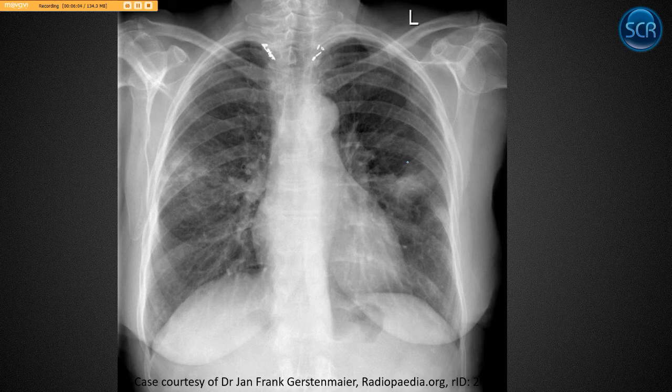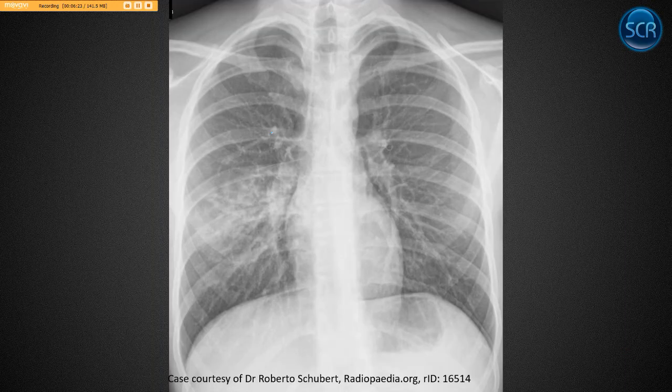Here's an example of someone with pneumonia, and so you can see that they've got these diffuse opacifications in the lungs, indicating infiltrative changes. We call this consolidation. So we have air replacement with water. That's consolidation. So this indicates pneumonia, most likely. All right, here's a diffuse consolidative area on the right mid-lung zone, and you can see it's pretty normal hila here in this case to compare with the prior cases.